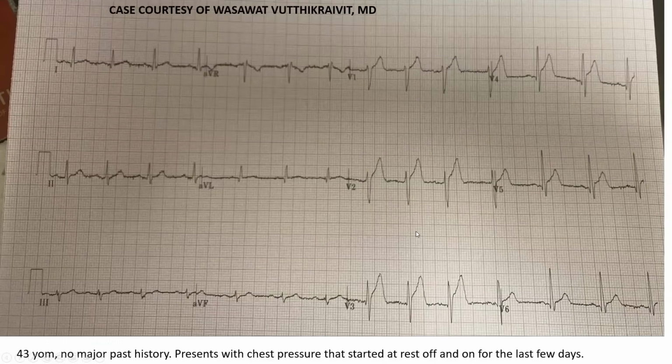This is, in my opinion, definitely an anterolateral STEMI. One hint is whenever you see that ST-T complex equal to or bigger than the whole QRS, that's always very concerning to me.